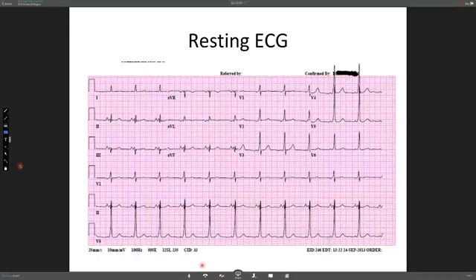It should be negative. So one thing is WPW, RVH, just things to think about. Of course, in this case, it's obvious that there's a short PR interval and delta wave. The other thing is muscular dystrophies can also be associated with a positive complex in V1. And dextrocardia. Those are the four things.